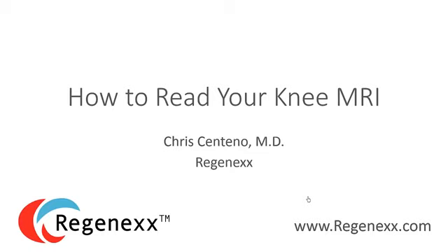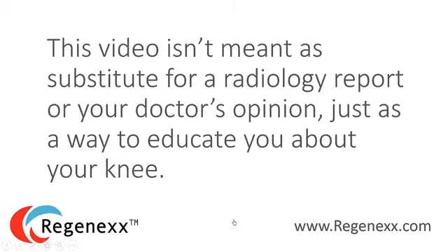I got the idea for this when a friend had a knee injury, got an MRI, was sent home with the CD, and just jumped on the internet to try to figure out how to read it. And I'm sure there are a lot of people that do that. So my goal here today is not to teach somebody how to become a radiology expert or how to read more information off the MRI than they might get from a doctor's opinion or a radiologist reading, but just to give you some idea about what to look at and to educate you about your knee.